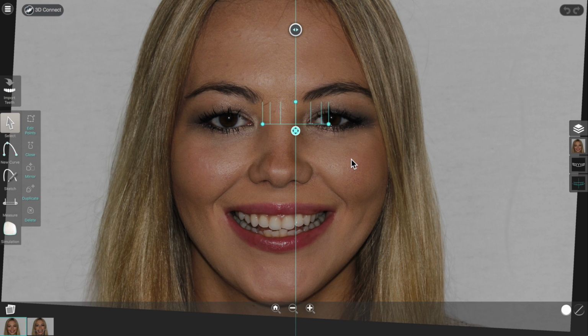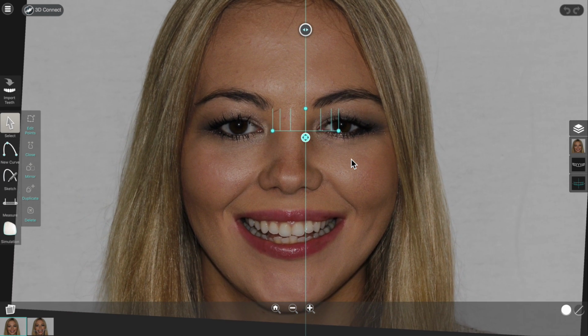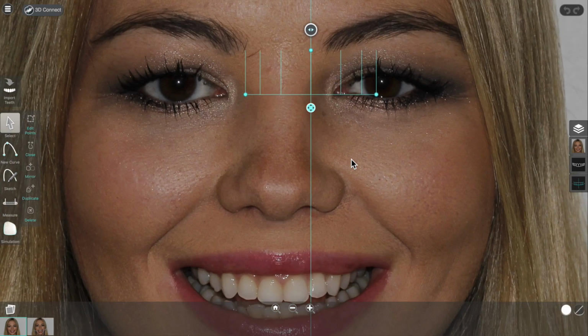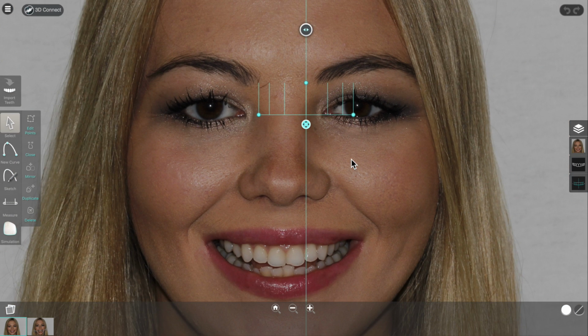But on the desktop version, you have a bunch of different options for controlling the view. You can use the arrow keys to pan the view up and down. You can use the command up and down keys to zoom in and out. So on Windows, that would be control up and down. And on your laptop, if you're using a Mac with a trackpad, you can use two-finger gestures there also to pinch and zoom.